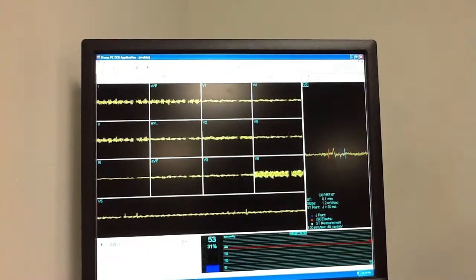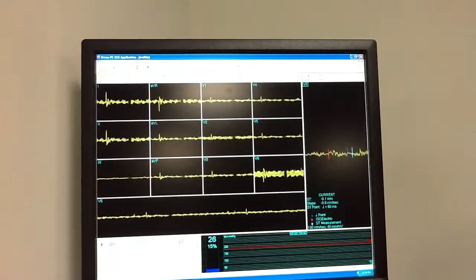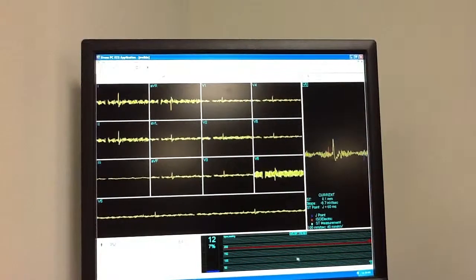And then we'll see blood pressure, you'll see miles per hour, systolic, diastolic for the blood pressure, and then our heart rate and blood pressure trends. So this will show trends and changes, which can be very important when we're testing a subject.